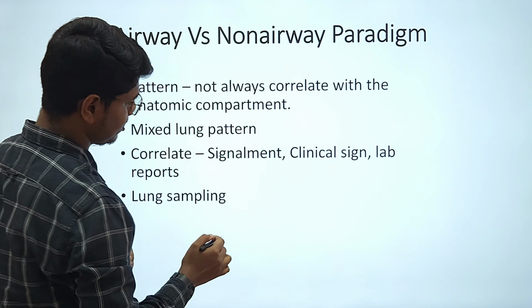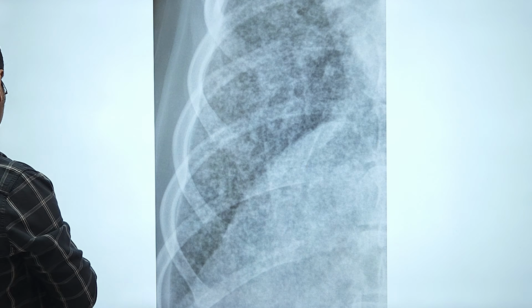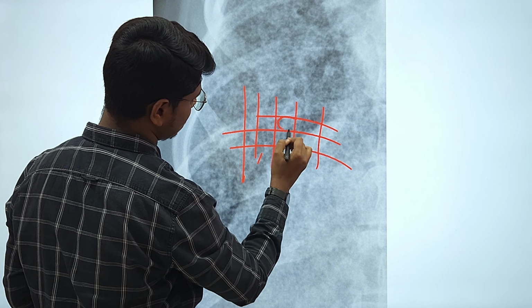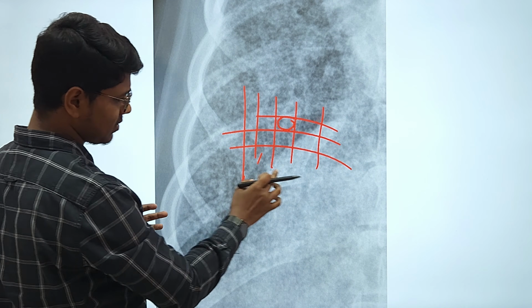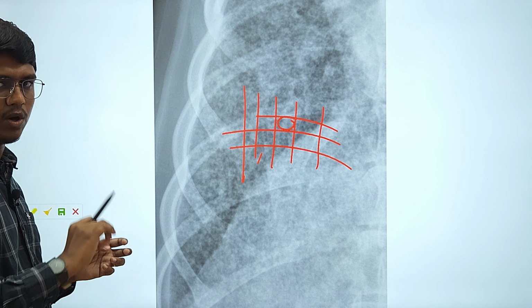Let us see another radiograph, see this one, this particular radiograph is also the same. If we divide this into unit areas, we will find that the opacity is not that strong or intense like the alveolar pattern, where there is complete soft tissue opacity. There are soft tissue opacities, but they are not that intense. So it is unstructured.